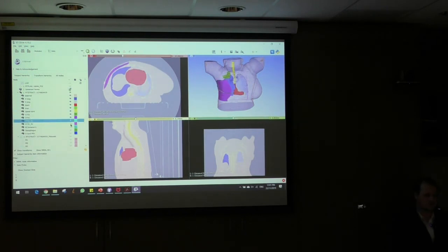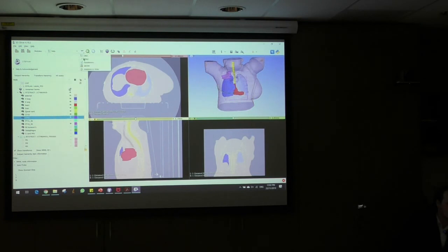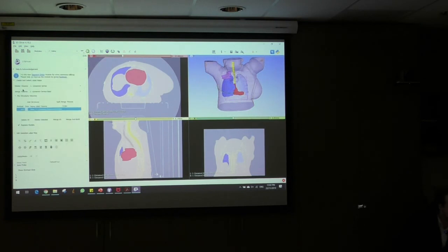Can it handle non-uniform slice thicknesses? Sometimes what happens is series come with a 2 millimeter slice thickness. After a couple of slices, for some reason it becomes half a millimeter slice. Then the planning system sometimes says that okay, it needs to be uniform. Yep. So it does have its internal slice thicknesses. I believe you can find that.